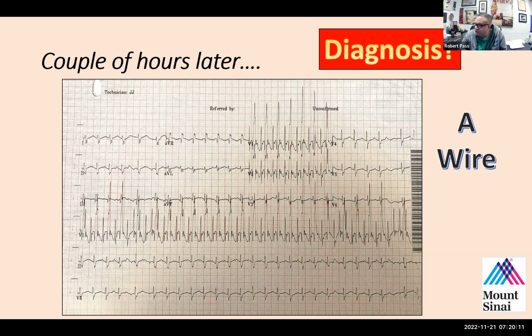Well, what is the rate of the atrium there? How many boxes are between the two? I just see 1, 2, 3, 4. Yeah, it's about 4 boxes, right? So 160 milliseconds. So what does that make the rate?